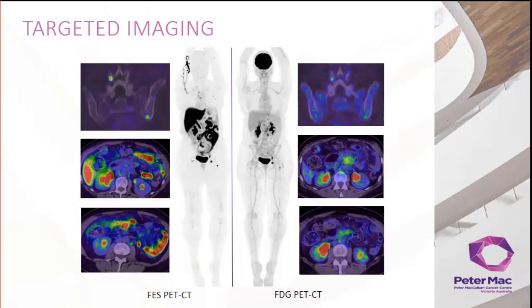This patient presented with rising tumour markers and significant upper GI symptoms on a background of prior ER-positive lobular breast primary. No disease had been detected on CT, MRI, or FDG, and gastroscopy was negative. She presented to us with increasing upper GI symptoms and continued rise in tumour markers. With knowledge of prior negative imaging findings, including FDG, and the ER-positive lobular histology of the primary, we agreed that FES could be contributory.